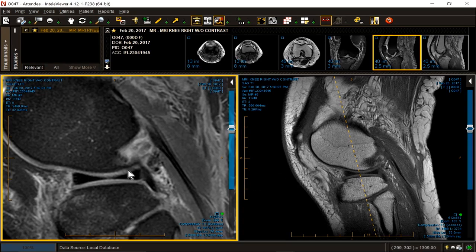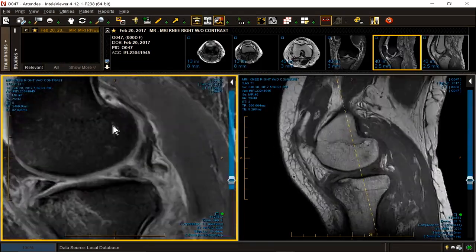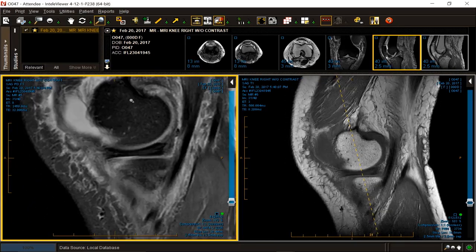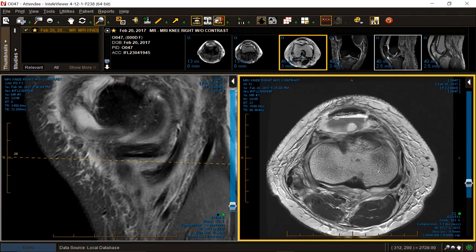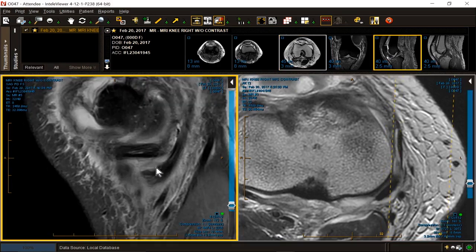Let's go over to the posteromedial corner, because this case looked initially like an innocuous fracture and PCL tear, which would be non-surgical. Okay, so here's our semimembranosus. We weren't that impressed with the semimembranosus axially, but we did say the tissues around it were a bit swollen, like here and here and here. This is a T2, and it certainly is swollen.